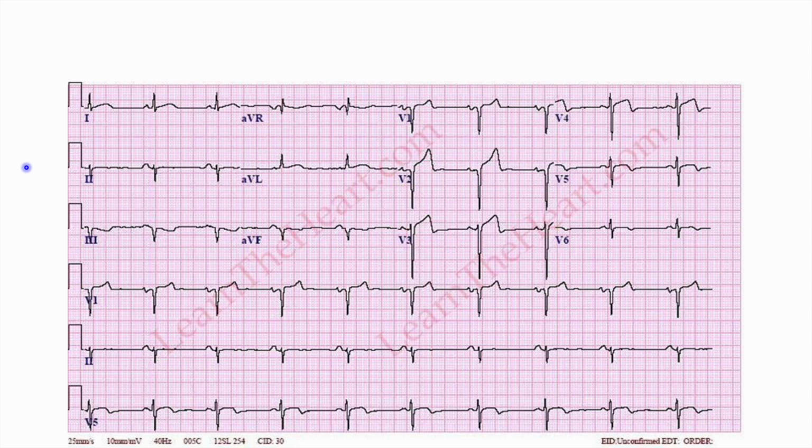3, 2, 1. This is another STEMI in our anterior leads, and so that's likely going to be our left anterior descending. You see this, everything looks fine, and then boom, V2, you have ST elevation, V3, ST elevation, V4, ST elevation, not really ST elevation past here. So we see anterior leads have some ST elevation. Do our reciprocal leads have depression? Let's look at our inferior ones. That looks like some depression to me. It doesn't have to be incredibly drastic. You just need greater than 1 millimeter of change. So this is an example of a STEMI in our anterior leads, likely LAD.